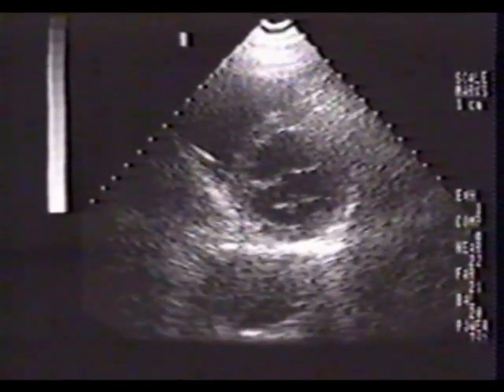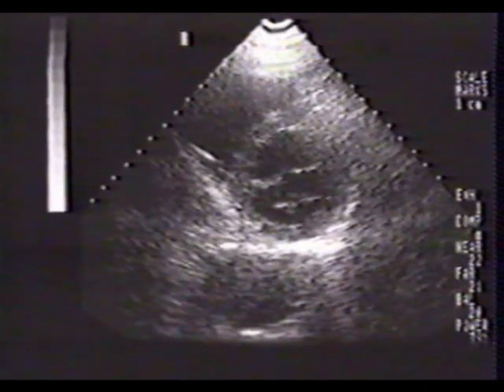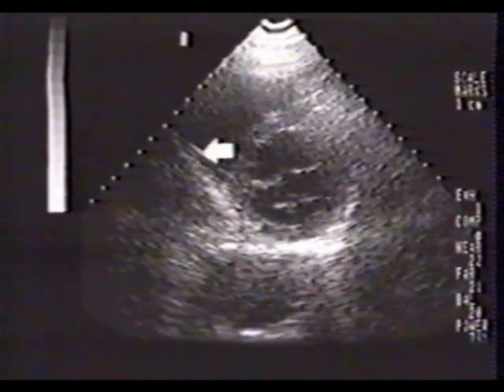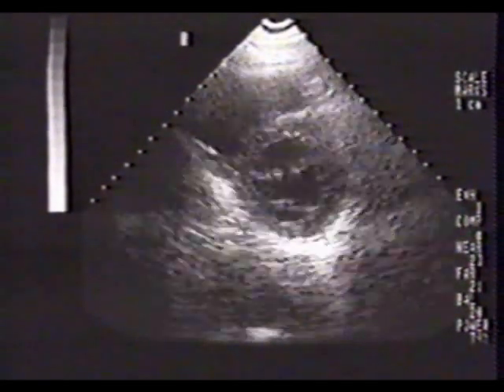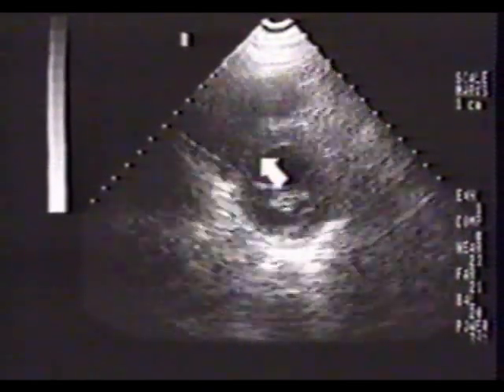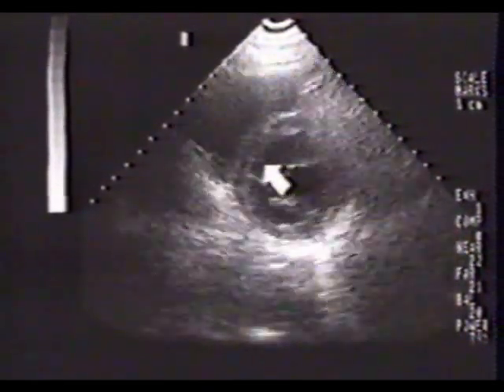This is the patient we presented earlier with acute inferolateral infarction. With every inferior infarct, the echocardiographer should pay particular attention to the inferior septum and the inferior wall of the right ventricle. The anterior septum demonstrates normal systolic thickening, while the inferior septum is akinetic.